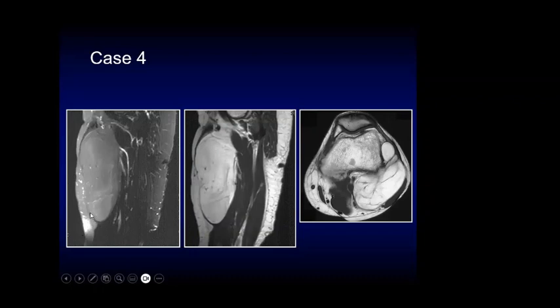So the tumor is here. The tumor has fat suppression, but the lateral aspect of the subcutaneous fat has some sort of inhomogeneity. Okay, so if we have a tumor that is high on T1 and has homogeneous fat suppression on T2 fat sat, what do we call the tumor? Lipomatous, mostly lipoma. Okay, is it a simple or a complicated lipoma?